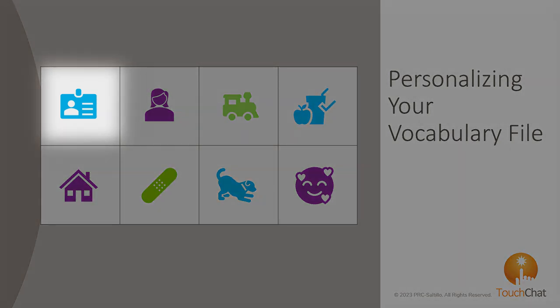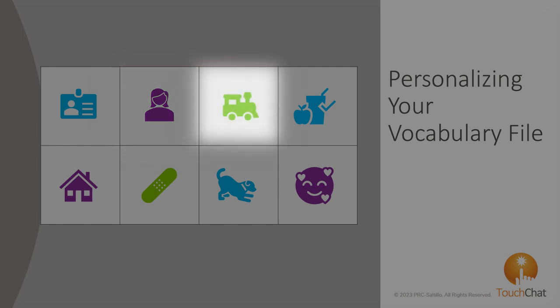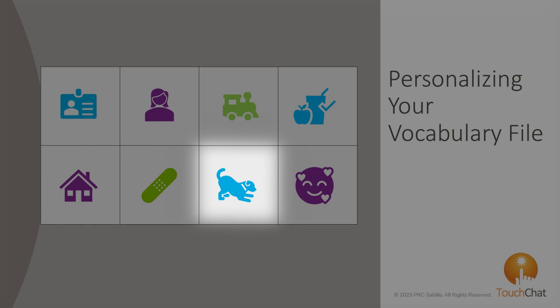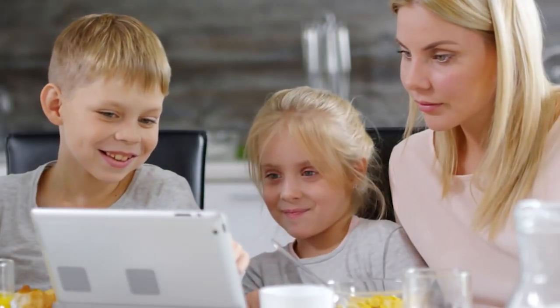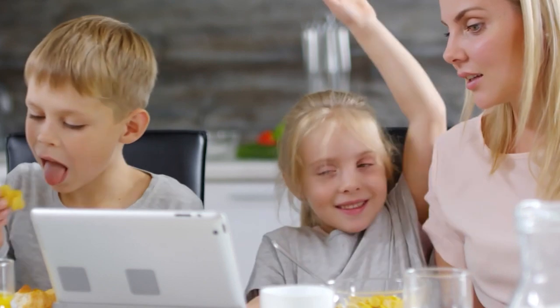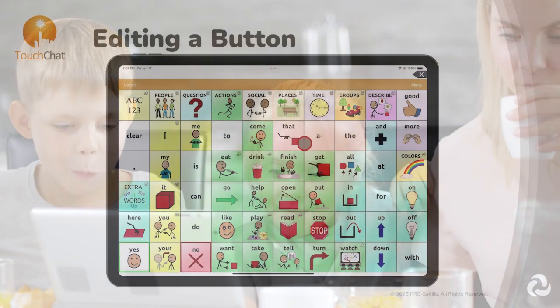Things like their personal information, people in their life, things they enjoy doing or playing with, favorite drinks and foods, places that they go to, medical information, pets or favorite animals, or any other favorite things, places, people, or sayings. Having these words available can help motivate your AAC learner to be engaged in communicating about things that are important in their life or that they enjoy.